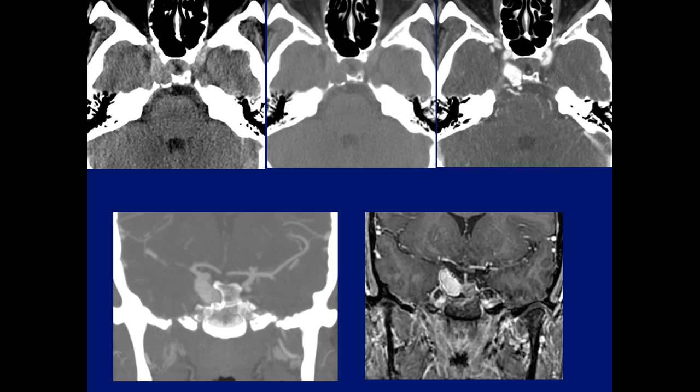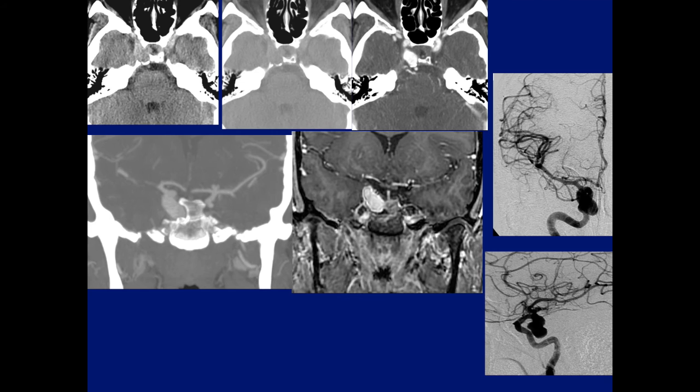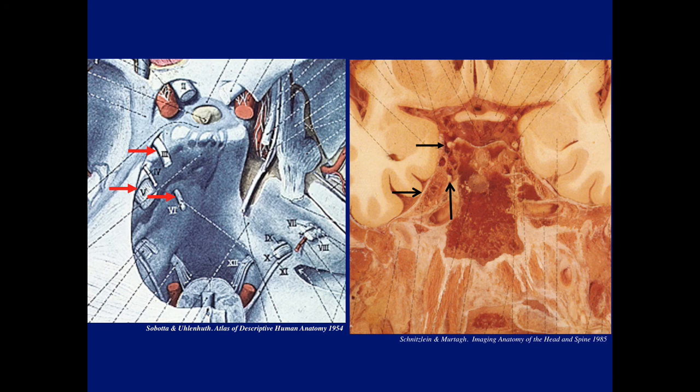PCOM, as Asif said, correct. Notice on the angio, a massive PCOM aneurysm. And the interesting thing here is what has happened. This aneurysm has eroded the right side of the clivus, and that will explain the patient's symptomatology of the 3rd nerve and the 6th nerve.